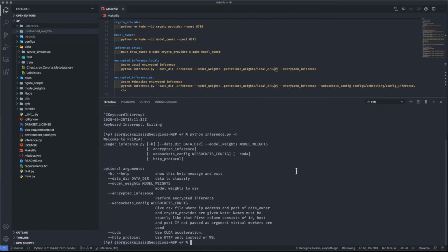So it's really not a joke. And if you're seeing strange behavior related to the process reaper killing your inference process, it's because you're out of memory. So you either need a really big swap file, or you need to use like a really beefy machine or a server. So if this doesn't work, you might need to downscale the images.